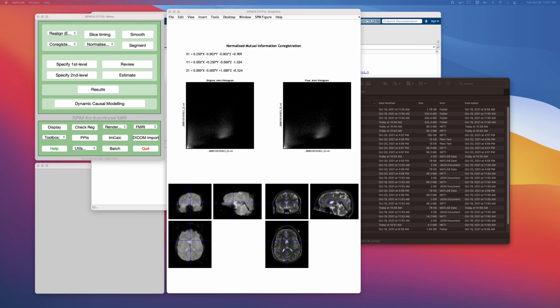All right. The problem is that that makes the T2 sort of limited. You can see, and we talked about this before, that the resolution of the T2 is good in plane, in the XY plane. But in the Z plane, the resolution is bad. That's because it's just copying the geometry of the EPI and it's just doing 32 slices.